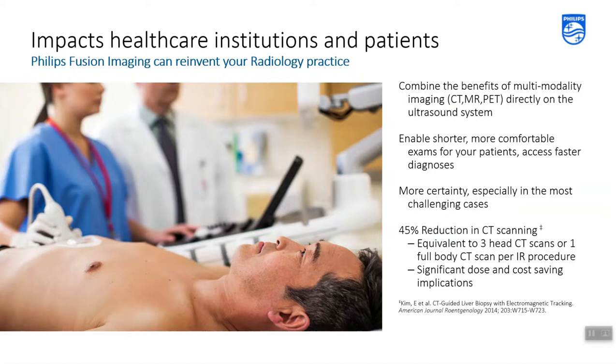Another benefit is comparing the images from different time points. Maybe the patient has undergone the CT exam last year and today you want to monitor the disease state. With fusion imaging, you can fuse the historic CT images with real-time ultrasound, and this can positively influence the treatment pathways without exposing the patient to a repeat CT exam. So fusion can help to expand the role of ultrasound imaging.